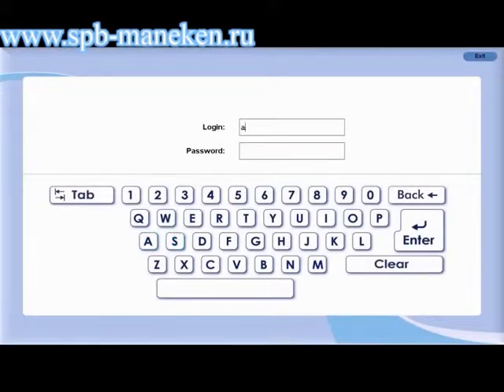The position of the tracking unit can be adjusted on the software interface to ensure the most effective tracking with the highest precision.